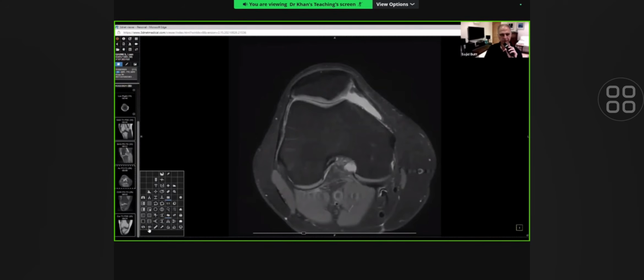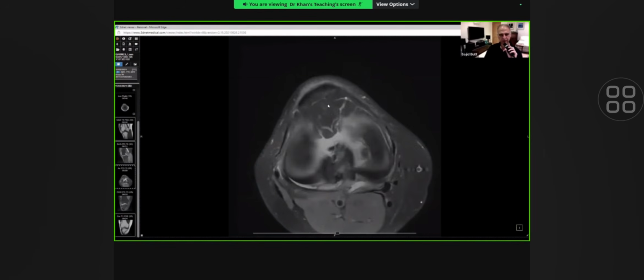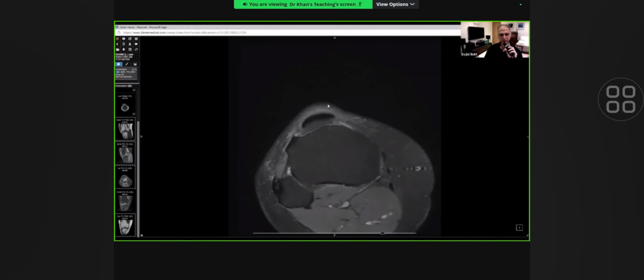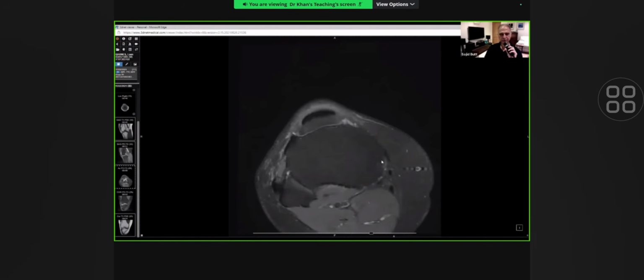If you want to measure the trochlear tibial tuberosity distance, you find the central point of trochlea, then you go down to the tibial tuberosity. I've not moved the mouse, so come down, and from there to the central tibial tuberosity, it's only about 1 centimeter here. So we are allowed up to 2 centimeters. So the trochlear tibial tuberosity distance is normal.